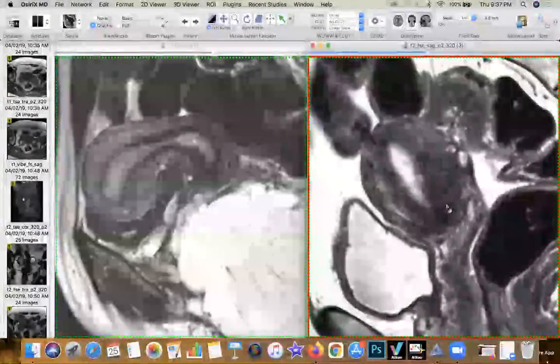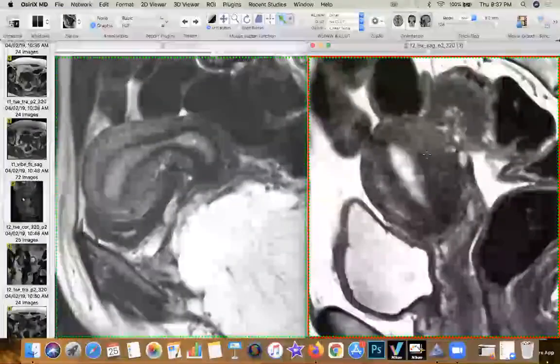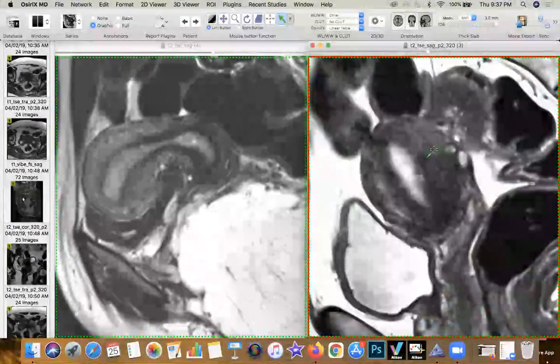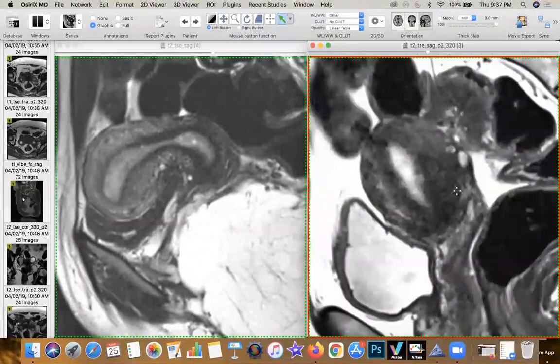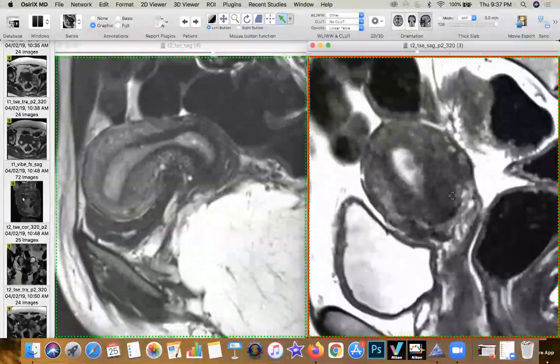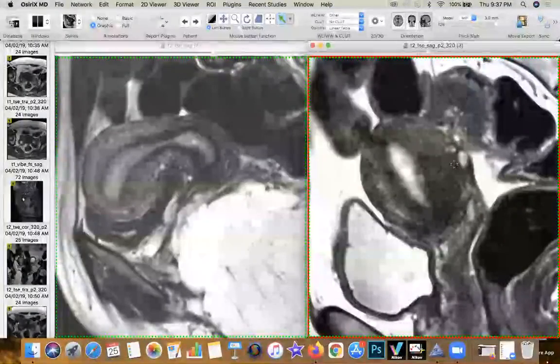And if you look very carefully, it's very important to remember that this is the junctional zone. You can see the delimiter. This signal you're seeing out here is separate from the junctional zone, and it's not a sequelae of adenomyosis. It's just that the endometriotic tissue produces a desmoplastic or a fibroinflammatory response even in the myometrium, and you would call that a pseudoadenomyotic appearance of the corpus itself. So now you've got all the features which are now going to help you make the diagnosis.